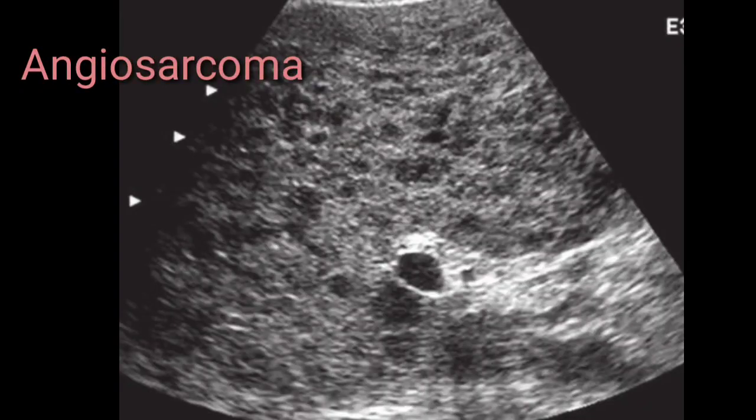Hopefully these images will help you to understand metastatic disease in the liver, in the splenic parenchyma. On this ultrasound image, the spleen is enlarged. You can see the spleen is grossly enlarged and its parenchyma is interrupted by multiple hypoechoic nodules of variable sizes. This presentation you have already seen in miliary tuberculosis, in microabscesses, and also in lymphoma, but this diagnosis is totally different from the others.